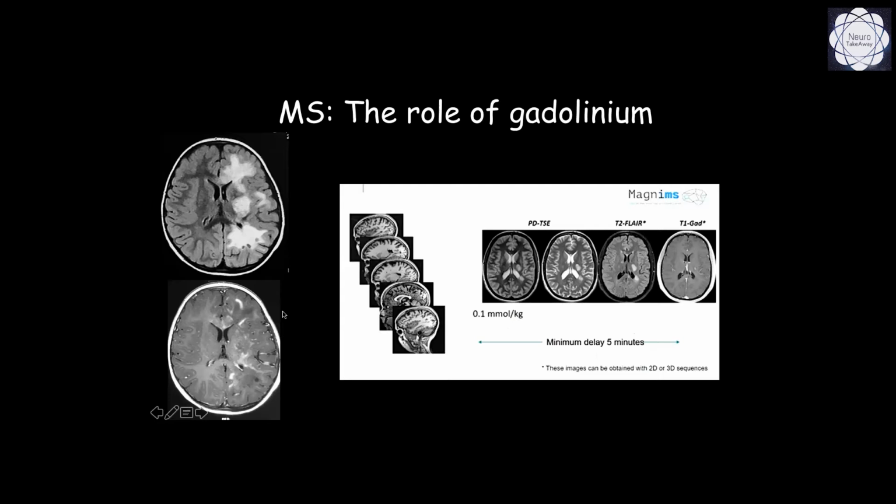And here we have a patient with a funny pattern of unilateral compromise in MS with a lot of lesions in the left hemisphere, open rings, some edema, some congestion, some mass effect, but not much on the ventricle. And this is a typical aggressive pattern of a unilateral process.